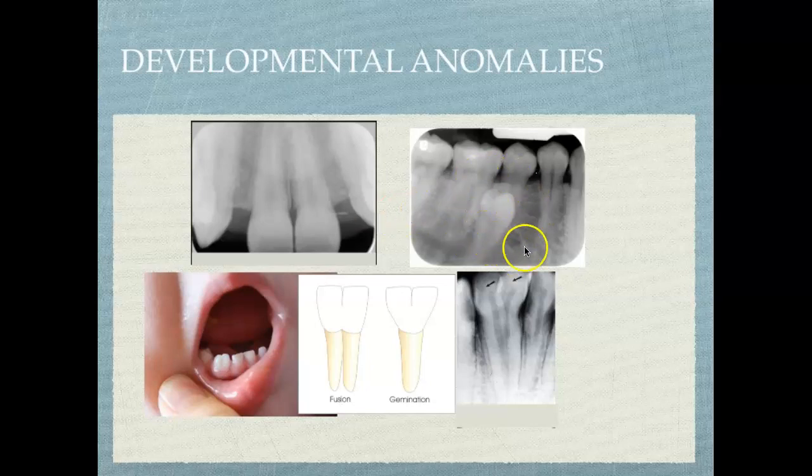When we look at this periapical, what are you seeing? If you thought supernumerary tooth, you are correct. So we see premolar, premolar, molar, molar, and then here's this premolar. I would venture to say that in the positioning of this radiograph, this supernumerary premolar could be impacted and not clinically visible in the oral cavity. It's a good chance it's impacted.